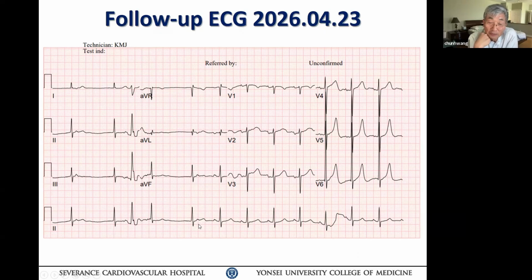So what are the possibilities besides the sinus rhythm? Somebody who had multiple procedures and surgeries. So clearly sick sinus syndrome, multifocal PAC happening, and then this particular coupling PAC triggered this regular sinus rhythm looking thing.